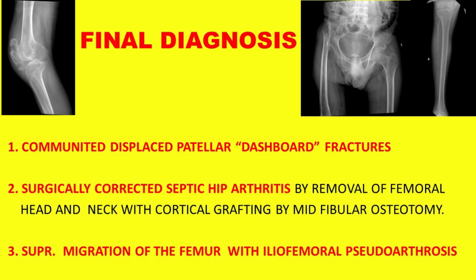So with all the above findings and the findings in the given X-rays, the final diagnosis: one is comminuted displaced patellar dashboard fractures. The second one is surgically corrected septic hip arthritis by removal of the femoral head and neck with cortical grafting by mid-fibular osteotomy. He also had superior migration of the femur with iliofemoral pseudoarthrosis. So that's the final diagnosis.